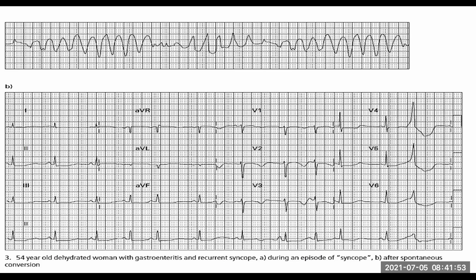Torsades. So what is torsades? All right, but anyway, let's analyze it. So what's happening here? What have we got? What does this look like? First of all, when you look at it, it's a tachycardia. Okay, so the heart suddenly goes into this extreme tachycardia of about nearly 300 beats per minute. So it's extremely fast.